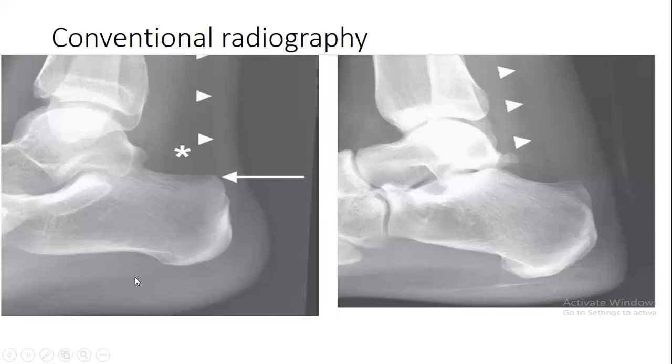On our screen, we have a conventional radiograph, which I was saying is for where there's no ultrasound and where there's no MRI. When a patient presents, a radiograph can still be taken. It can provide useful information. The only trick when you have to do a radiograph is that you have to do a high contrast image that will show both bone and soft tissue. If you overexpose, then definitely you are not going to see your tendon. You are not going to see your fat pads.